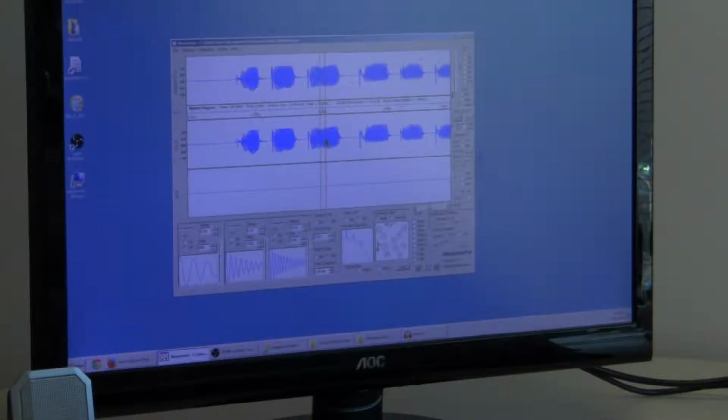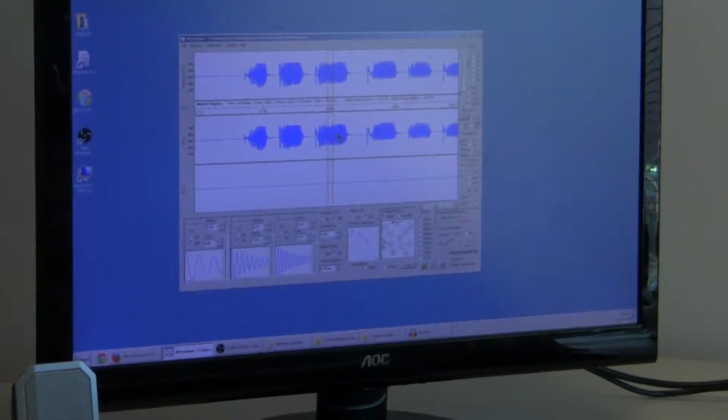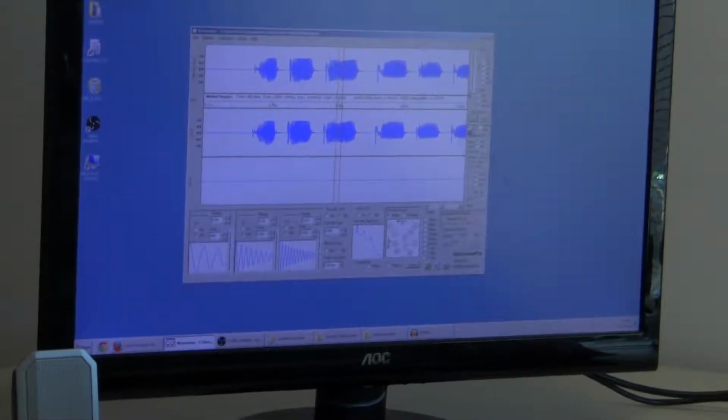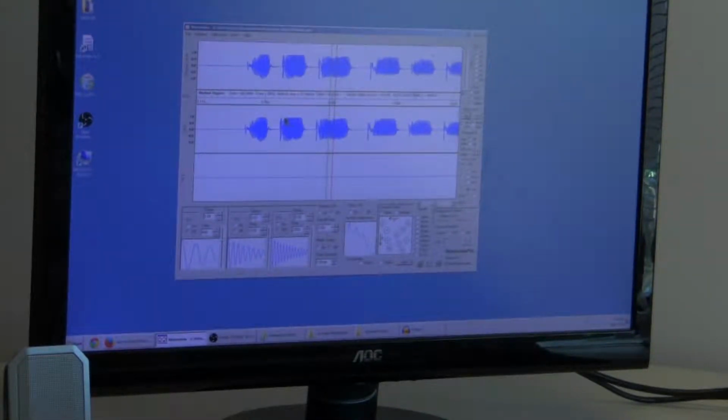The signal should look more like the third syllable or any one of the ah syllables. This is called clipping, so when we inverse filter, we'll take something from the third syllable, not the second. It's only a slight amount of clipping, but it's enough to make some distortion in the waveform.